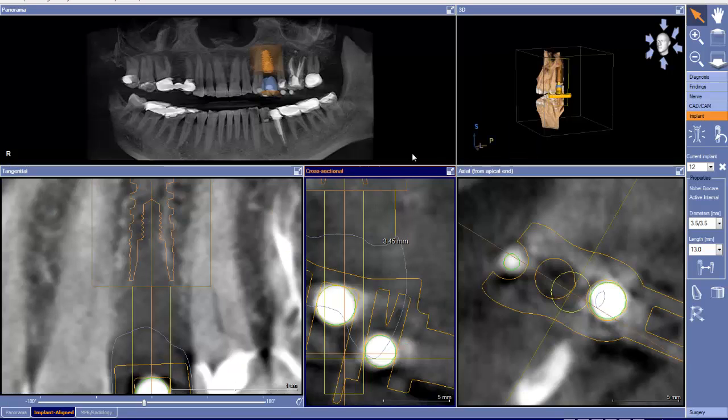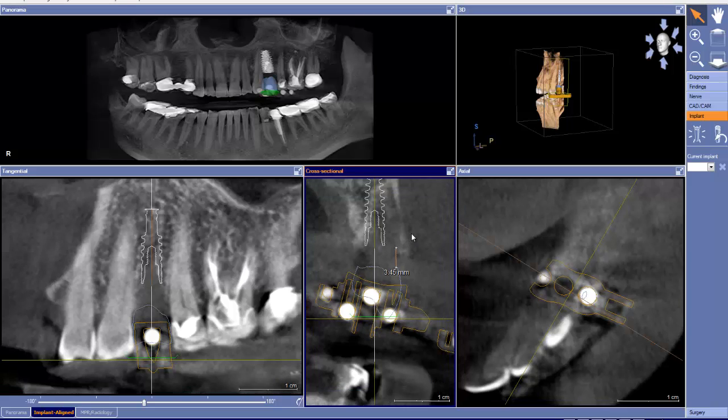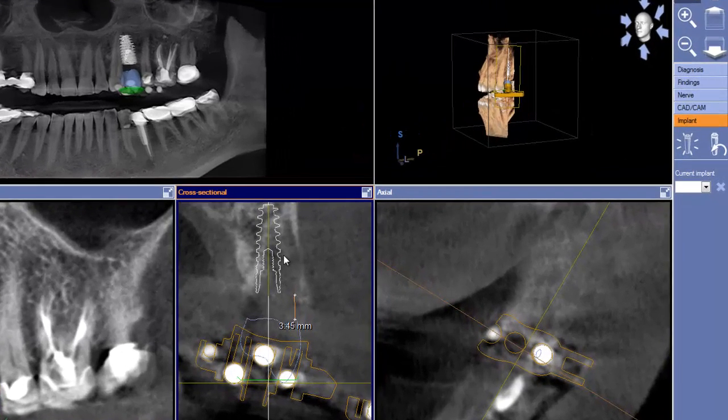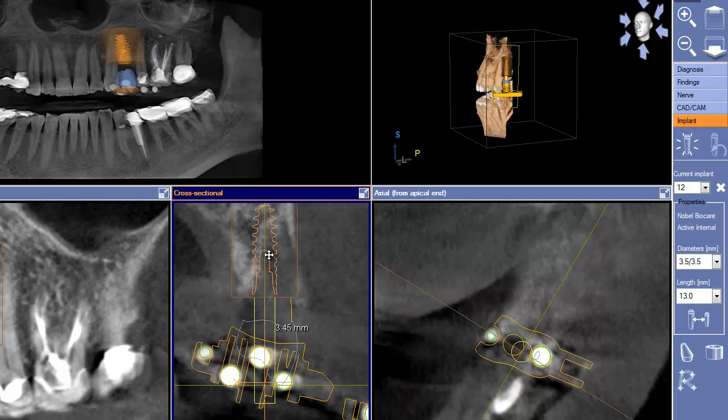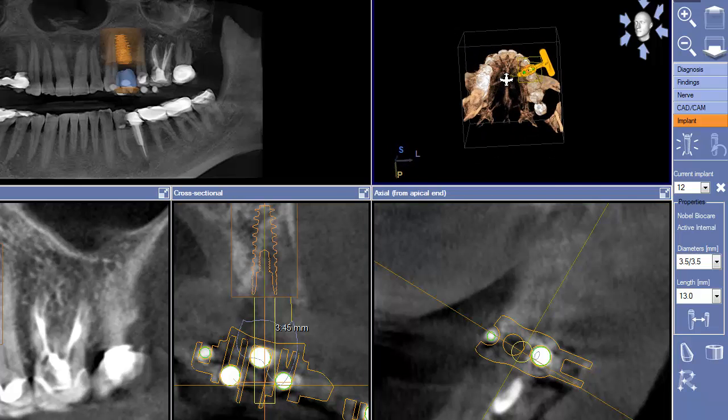So again, in this particular case, because the X-ray aid was placed a bit crooked, in other words, tilted to the buccal, leaning to the buccal, and it could be that the ridge is that way. In fact, we can look at it and see that the ridge is that way, and it's just one of those things we have to deal with. But I do want us to understand what the cause of that is. So again, on this particular case, we would need to have our D2 set at probably 25 to be able to mill this, and then go from there.